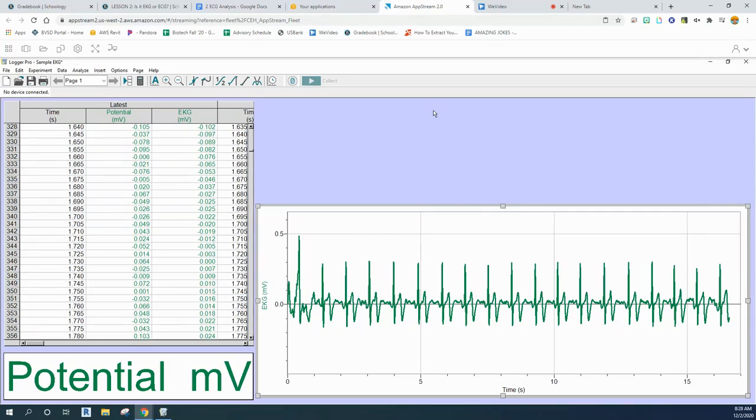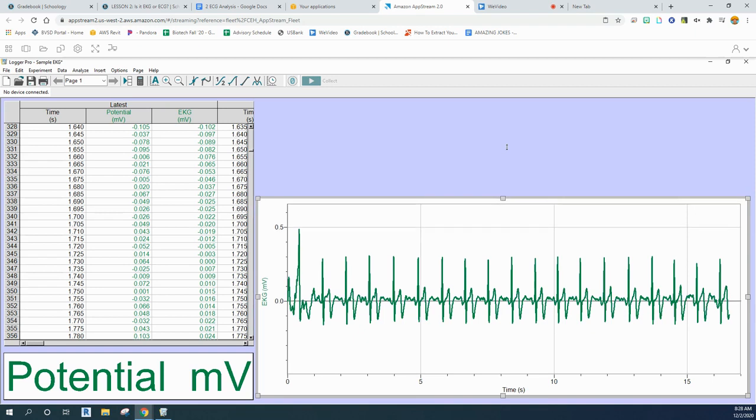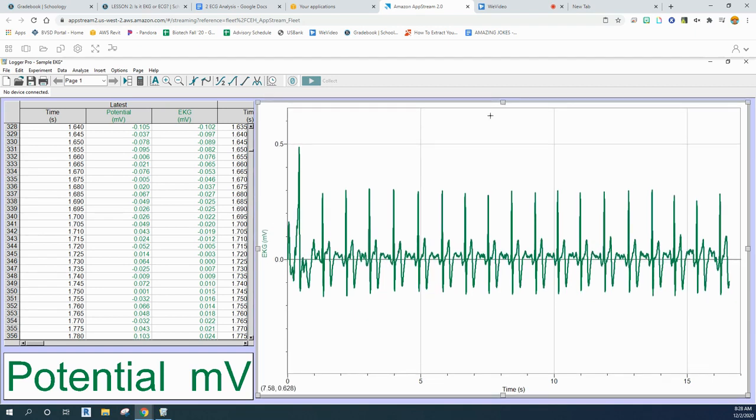Now that we have our file open, we're going to label all the different parts of this wave. So let's first zoom into one of them that we want to see. I can click on this window and then these boxes appear, so I can resize it. So you can size it according to your screen.